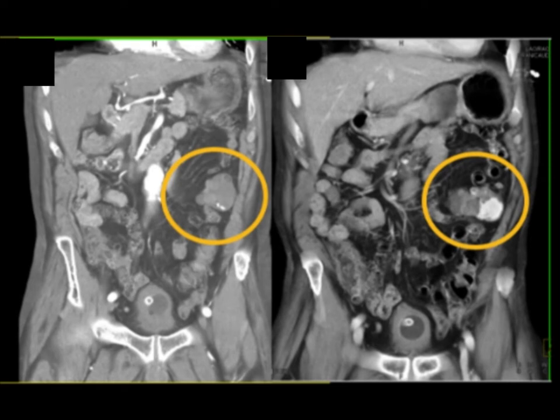One of the things we've been able to show is sometimes the bleed is best seen arterial and sometimes it's best seen venous. Sometimes it's equal. But regardless of the bleed, it always changes between our arterial and venous phase imaging. Usually it gets more, occasionally it gets less. That's why you're not going to confuse things with foreign matter, because this contrast enhancement is definitely changing.